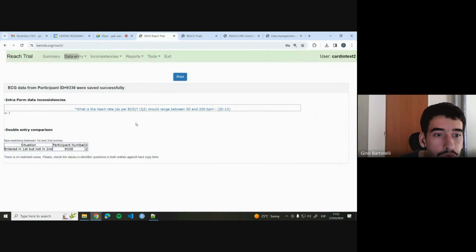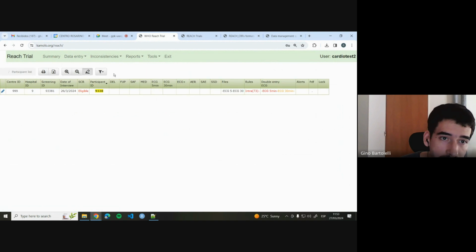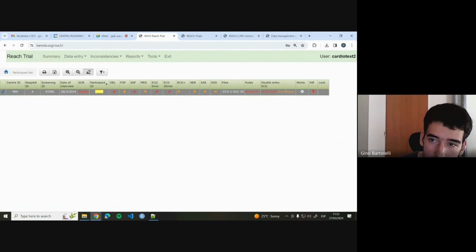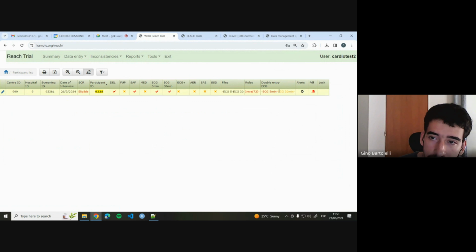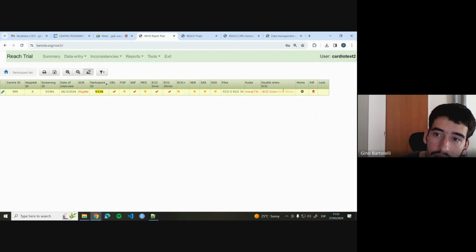Now it's just showing everything that I have already told you. But for example, see here that we have the ECG 5-minute. Now the system is also displaying the ECG 30-minute because we uploaded the ECG 30-minute as cardio 2, but for cardio 1 it's still pending. So the system is showing it to me in orange status.